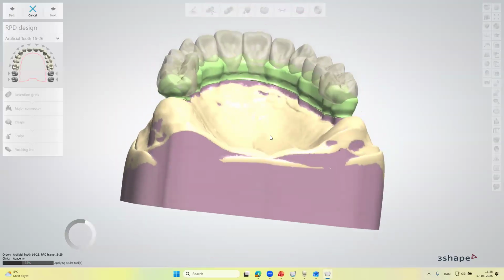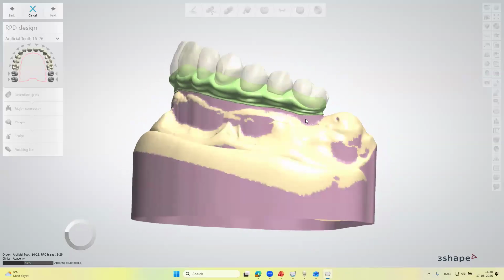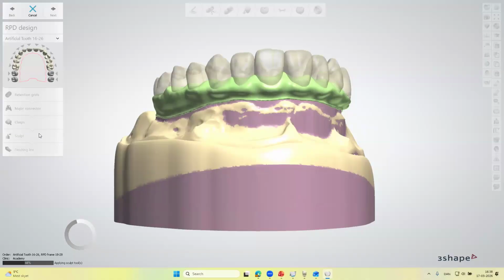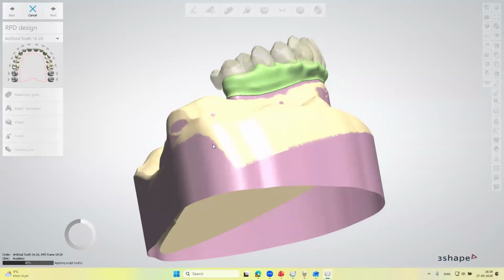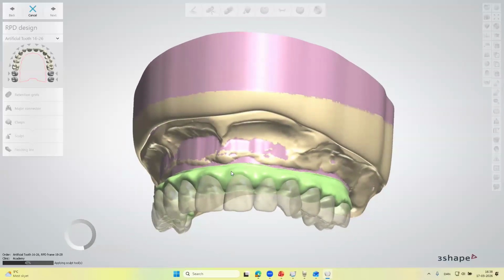The screen is not, let's say, in pause, so you can actually see how it's changing. Since I'm still in the Sculpt toolkit, you can see that it's a simple wax knife that I have added material to make it look a little bit more like a gingiva.